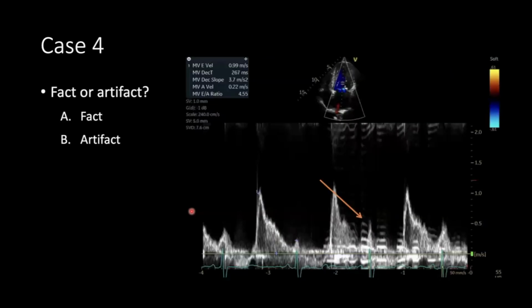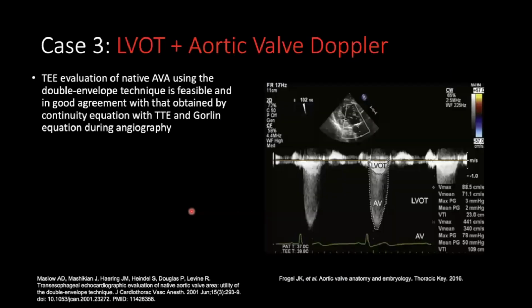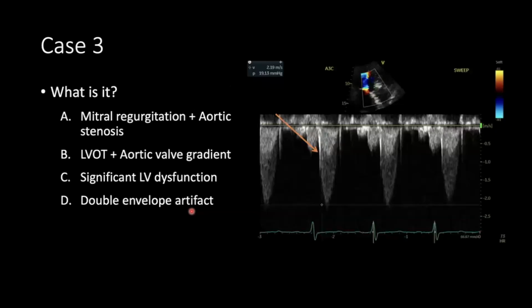Yeah. Okay. How would you know that's not LVOT and mitral regurg? So obviously, in this case, I'm cheating a little bit by not giving you more views. So you would obviously have that in a realistic scenario to know whether there is significant MR. The other thing that's helpful is the shape of the contour and the timing of the contour. So does it start after the opening click and end before? Whereas the MR jet starts a little bit earlier and depending on the mechanism can end a little bit later. So that's one way. Contour is the other way. Other views is the third way. Velocities, I want to say velocities is a fourth way.